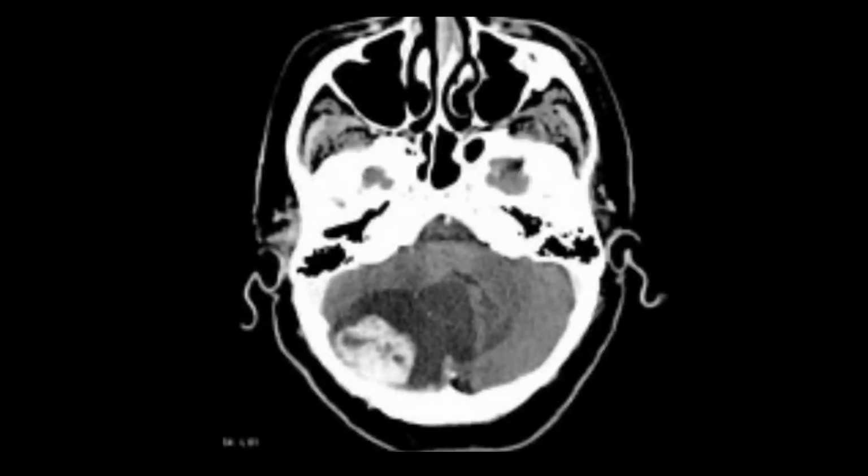Again, a very classical example of cerebellar pilocytic astrocytoma involving the right cerebellar hemisphere. Again, you will appreciate that this is a well-defined hypodense cystic lesion having an intramural nodule which is enhancing post contrast. So far as the surrounding edema is concerned, there is no appreciable surrounding edema in that particular case. So this is the cerebellar pilocytic astrocytoma, and the differential you should always keep in mind would be medulloblastoma.